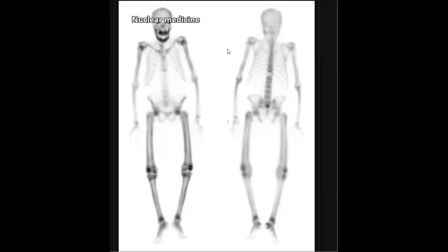Exactly. The best approach, as you mentioned, is to start with the kidneys and soft tissue. When you find absent renal uptake, and you also correlate with the soft tissue uptake, which is absent in this case, you are worried about a super scan. Then it's better not to stop, but to try to recognize which type of super scan it is in this case. So what are the types of super scan? What do you think?